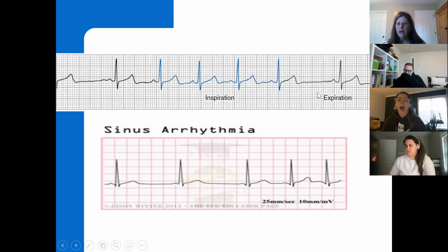It's just a little bit of an absence, but when there's not that pause or not that absence, everything looks normal and beautiful. It would measure out appropriately. Okay? I have a quick question. Yes. Would you always see it speed up during inspiration? Is that usually the pattern? I would say so. Yeah, I would say so. And then you're going to see at the end of the inspiration, this little pause and the expiration. But again, it all looks normal.